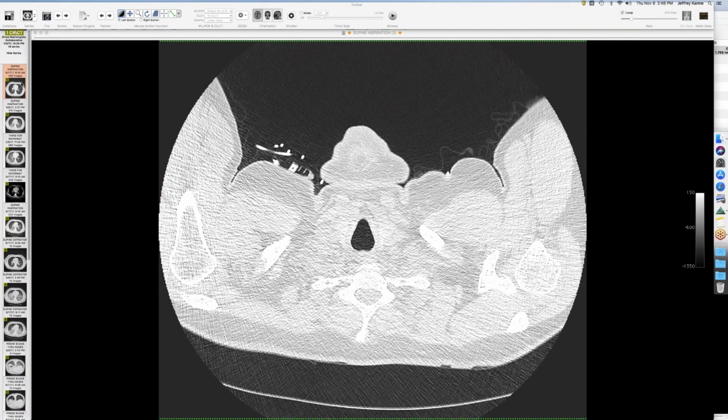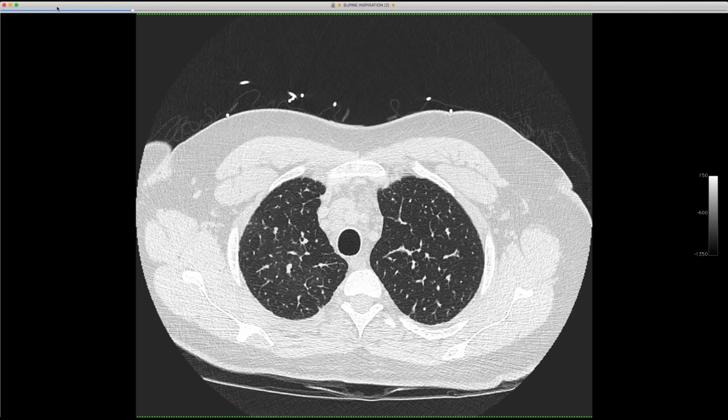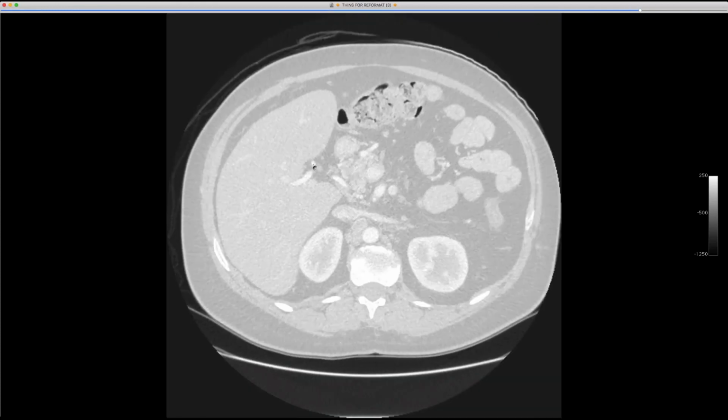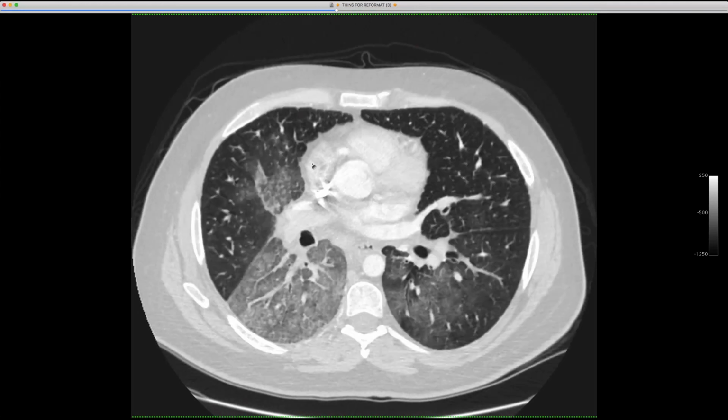You guys should be seeing a CT scan. So this is that case I had sent around earlier of this 30-some-odd-year-old guy who back in February developed, quote, pneumonia, didn't get better, was found to have IgG deficiency. Here's his initial CT scan. And this has been our exciting case of the week around here as we've gotten some more information.